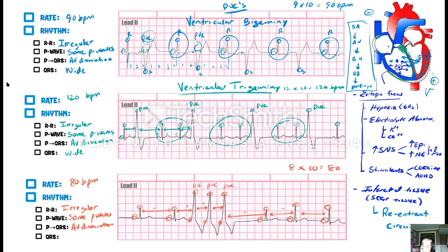Now here's the thing. PVCs can cause palpitations, right? And sometimes we're going to get to another rhythm, which we're going to talk about. This looks a lot like something called VTAC. So whenever you have something that is, again, look at the R to R interval here. Is it about the same? Yeah. So what would you call this? It's 1, 2, 1, 2. If something is about the same R to R interval, what is that? It's regular.